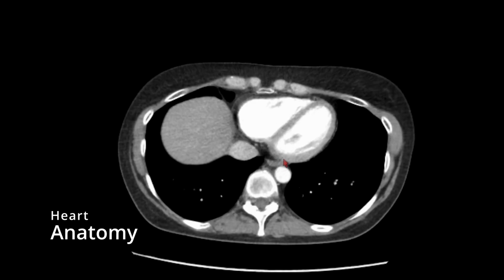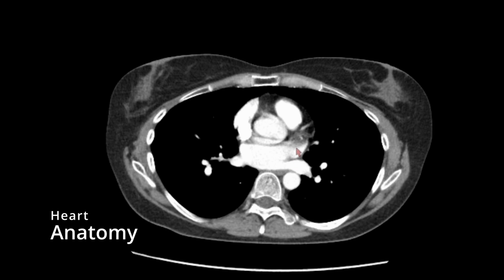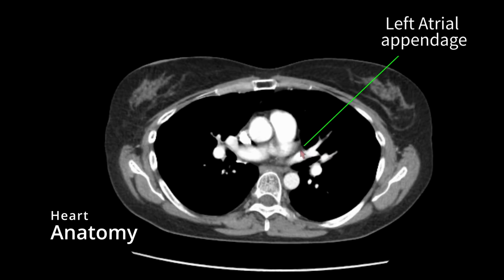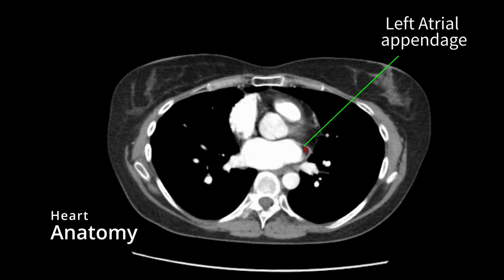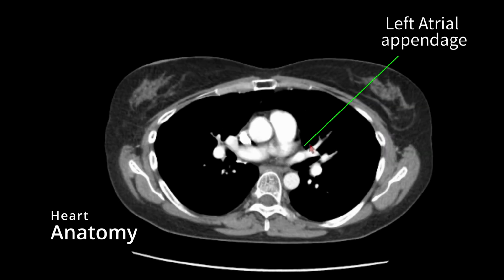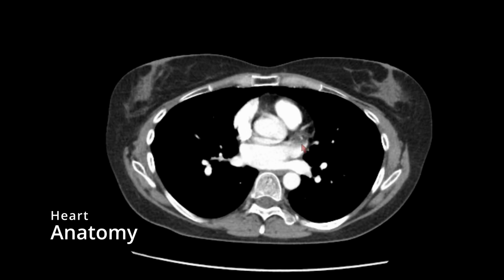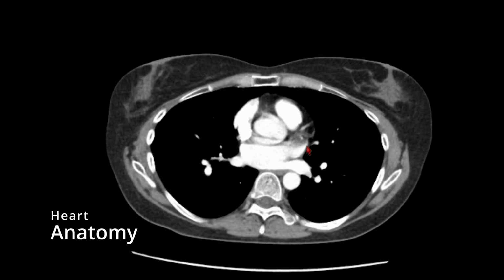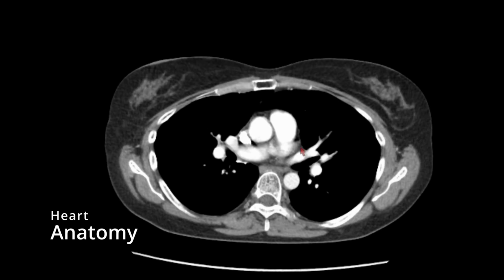In the left atrium here, an important structure to identify is the left atrial appendage, which is right here. And this atrial appendage can have thrombus, and also sometimes there is mixing artifact from the contrast. So artifactually, there might be some filling defect kind of appearance that may be misperceived as a thrombus.